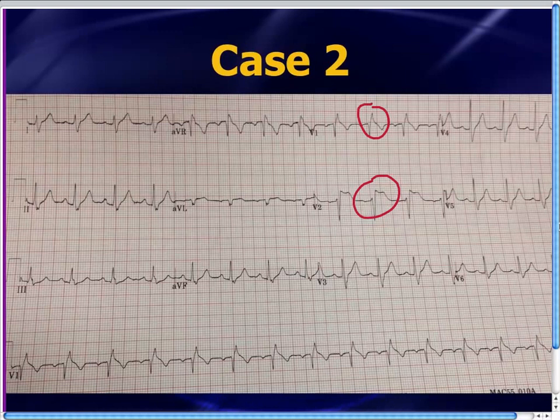That is Brugada syndrome, right? We've gone through Brugada syndrome before. If you're not familiar with Brugada, just go back over the videos over the past couple of weeks. Until proven otherwise, a post-syncope patient who is now completely asymptomatic comes in with an incomplete or a complete right bundle, who cares which one it is, but there's ST elevation in V1 and V2, maybe even out to V3. This has to be Brugada until proven otherwise, or our new term, Martini syndrome, until proven otherwise, right?